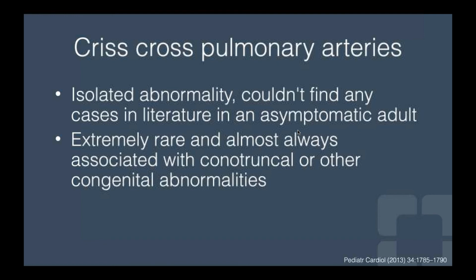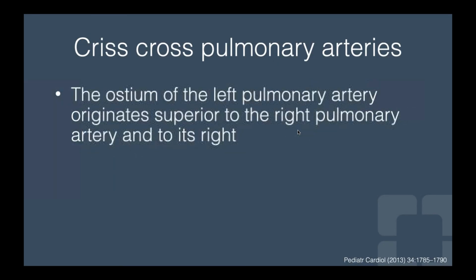I guess the main pulmonary trunk looks a bit funny. It almost looks like there's, well, I guess it's difficult to tell based off of this, but the contour looks off right there, kind of right at the distal aspect of the common trunk.